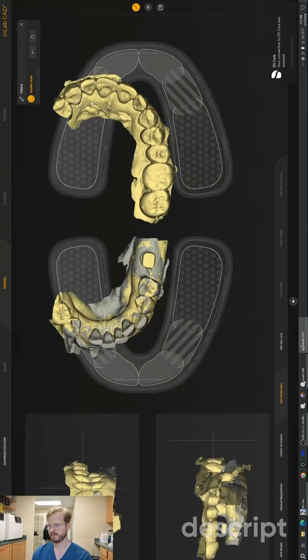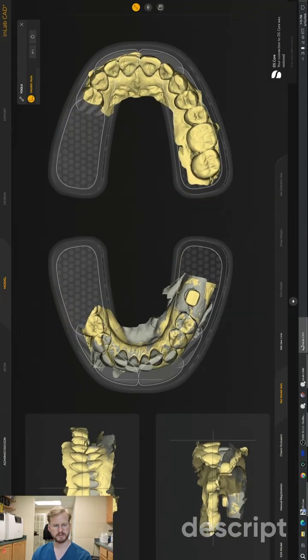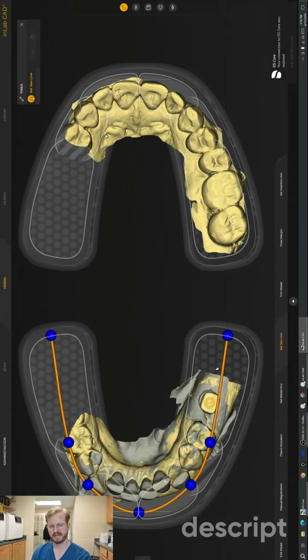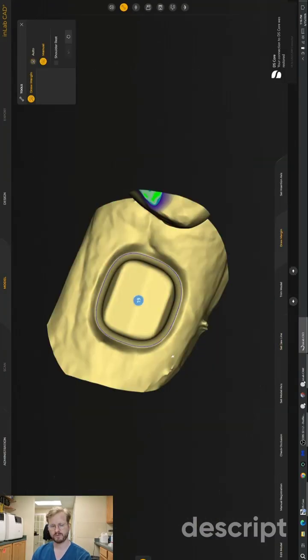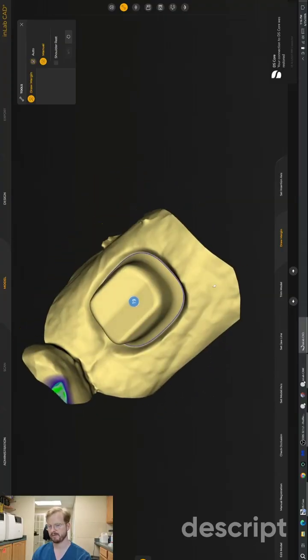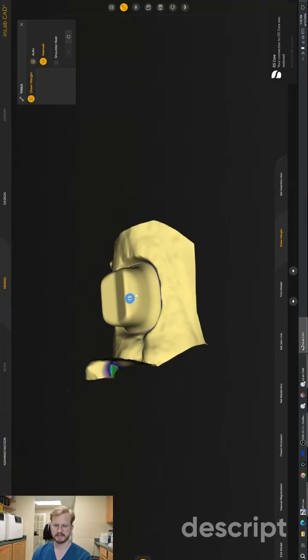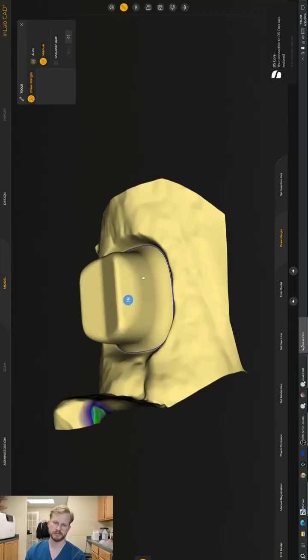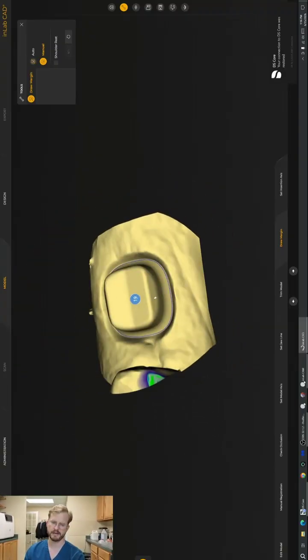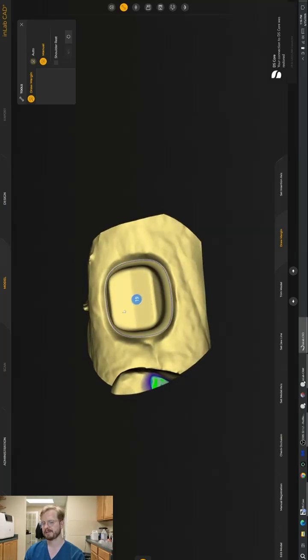So one thing you're going to notice about our file is that there is an abutment seated on it. We'll see it here in just a moment, but I scanned this implant this morning with the scan post. I sent it off to Atlantis, and they designed a custom abutment and sent me back a core file, which is what you're seeing now. So the core file is nothing more than a designed custom abutment that is seated onto this virtual file. So before this implant piece even shows up to my office, we can design and manufacture our patient's crown. Makes the process go faster.